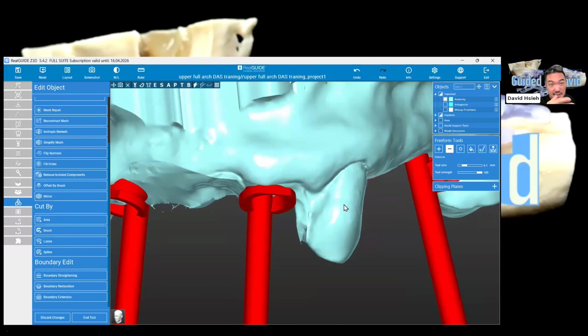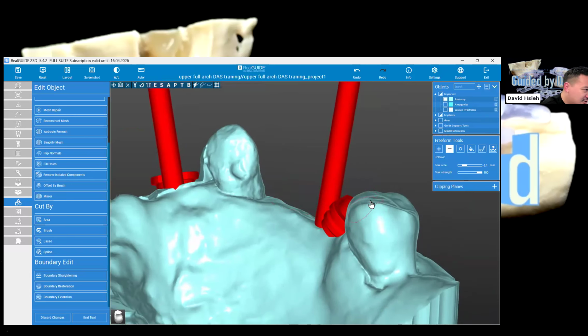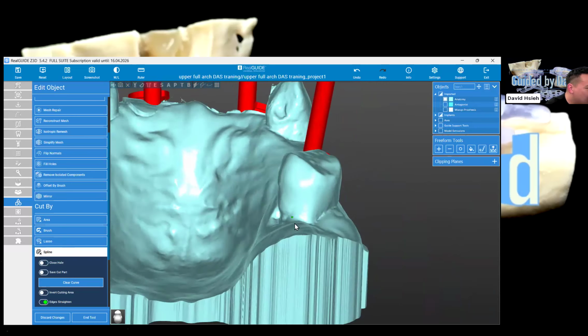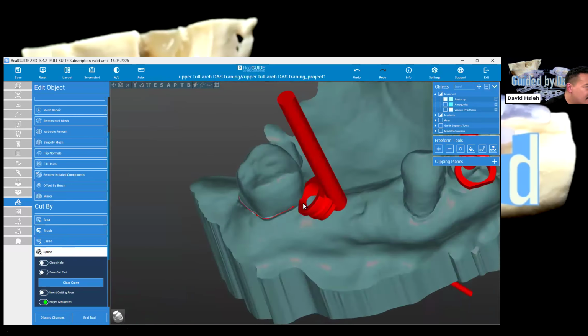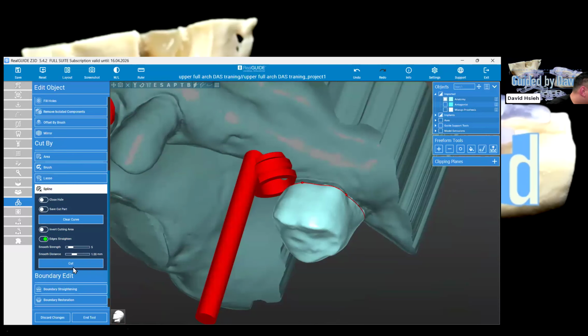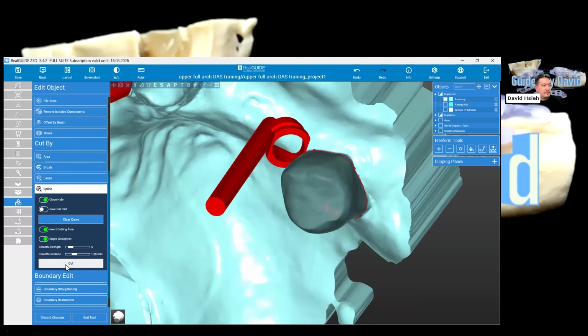But you can see the sleeve is still within the model, and I'll teach you a way to address that later. So these last teeth to remove, because the guided sleeve is in the way, so we have to take this guy out. All right. And then close hole, invert, and then cut. So the last tooth is now removed.